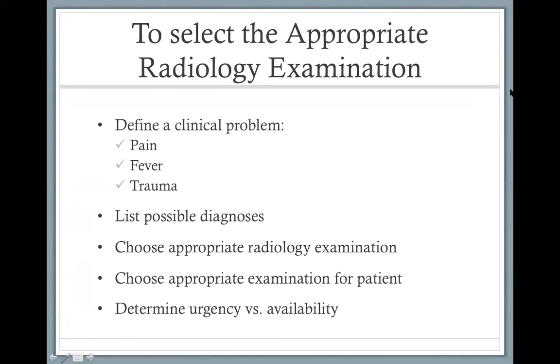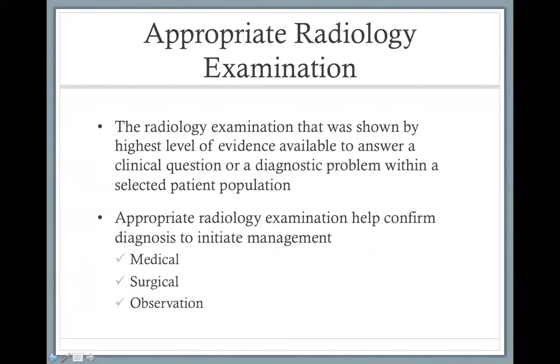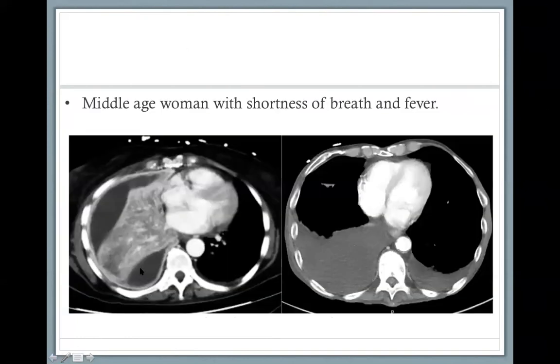I'm going to answer the question, what about lung abscess? Is it like edema? So I don't have a case with lung abscess, but if I take you backwards, lung abscess basically will appear lower attenuation. So it could be like this, but usually abscesses, just like empyema, they tend to form walls. So you might see a wall to it.